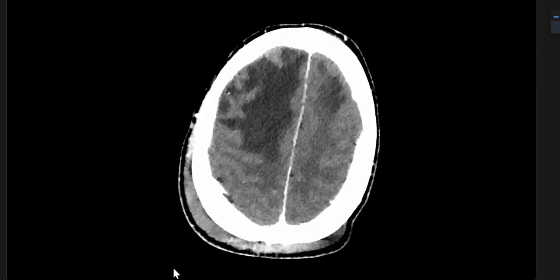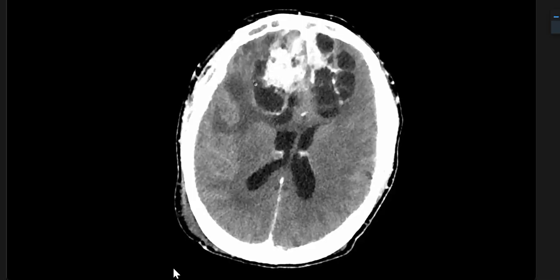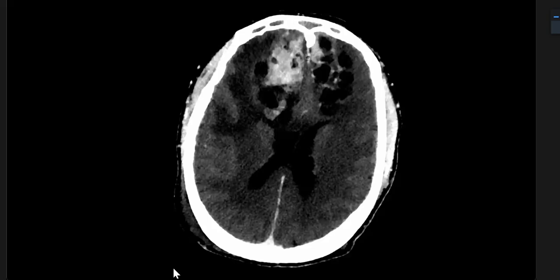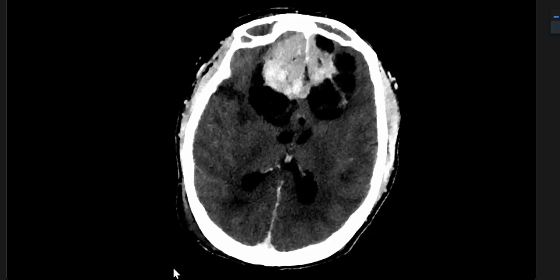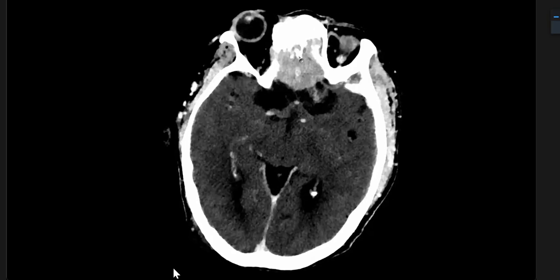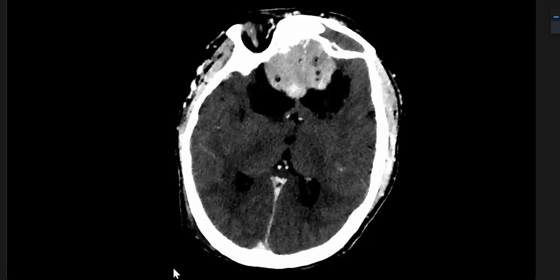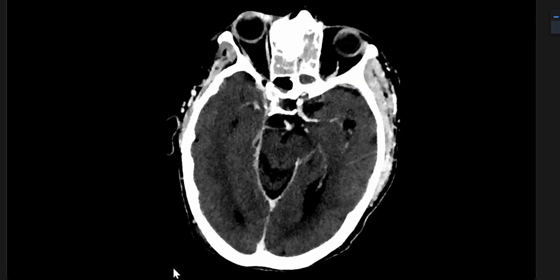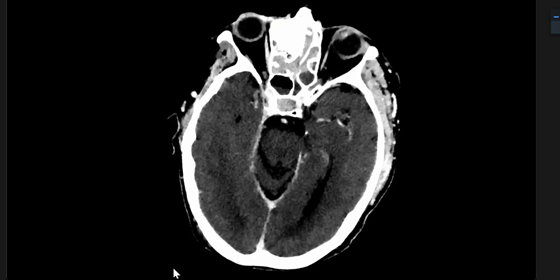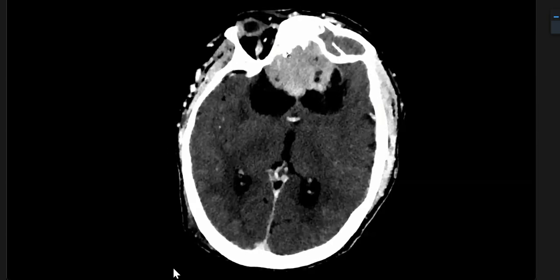Then you got this contrast enhanced CT scan. This gives you the diagnosis basically, because it's a very avidly enhancing mass. If you just track the mouse, this mass, you see the cribriform plate probably is destroyed. This mass basically arises from the nasal cavity in the olfactory bulb region, and then it just goes up and invades the intracranial area.